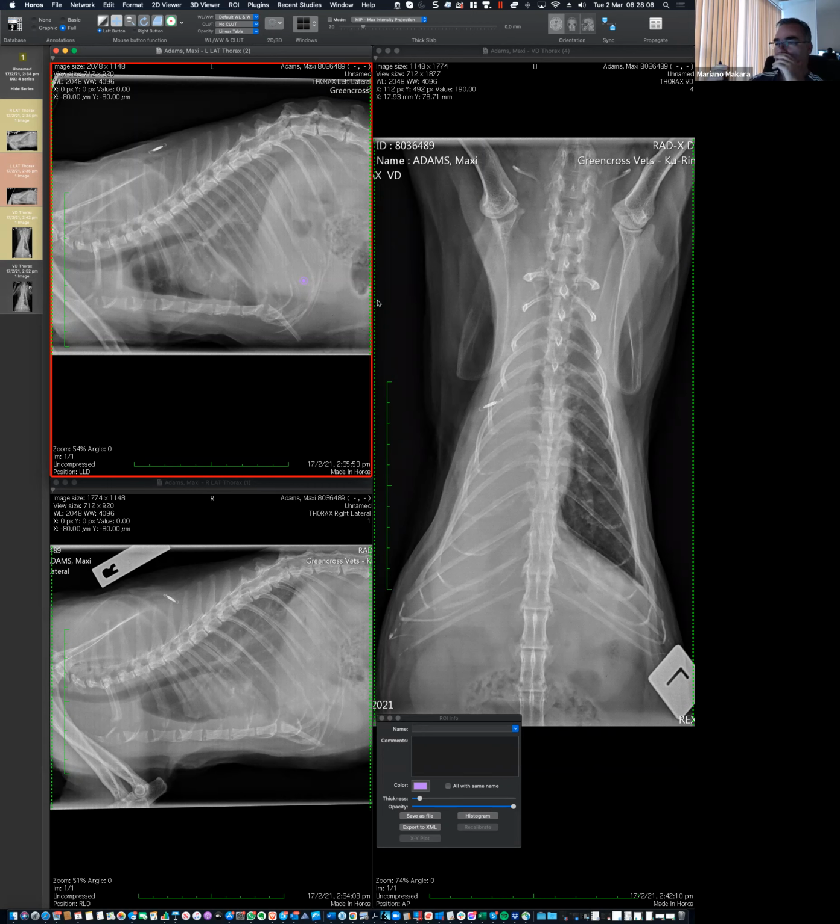And then we went through the hypothesis about where it could be. And now we need to go even further, and let's play the game and say, let's assume from the discussion, I think it's more likely for all of that to be lung. So let's assume that is the lung. Which kind of disease process can result in disappearance? And then we can play the game and think, let's assume that this is pleural effusion, and which disease process can result in disappearance? And then the next question is going to be what to do next. And then we come back to try to explain what appears like a mismatch between the projections, okay? Let's play the game like that.